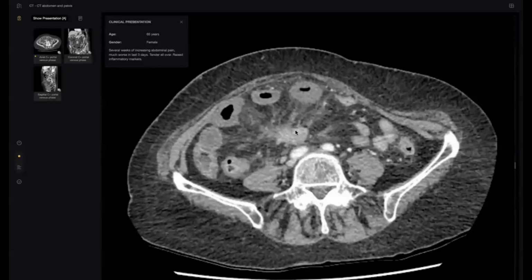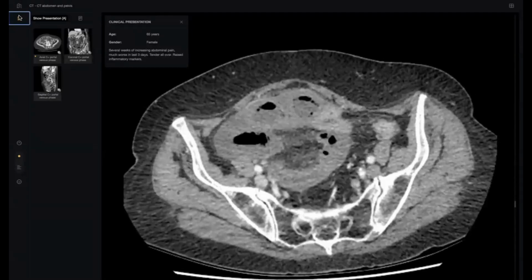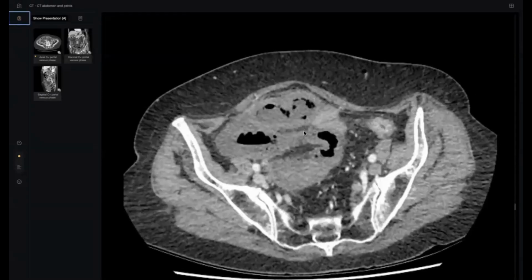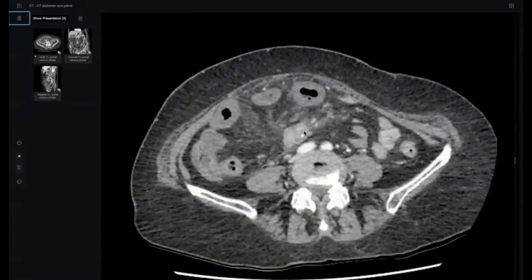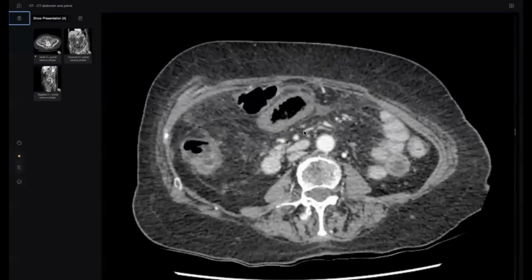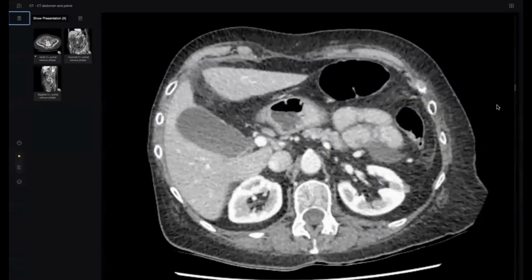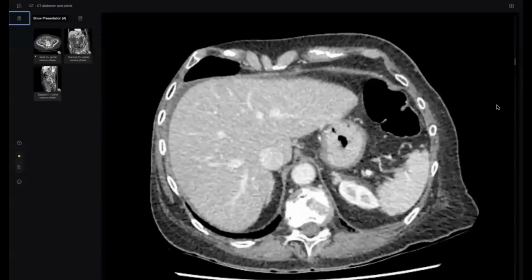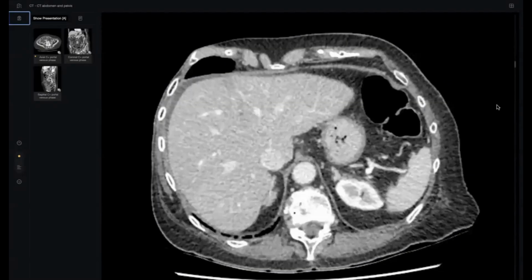Sir, I'm on the phone. Please, can you scroll for me? Yes. Hello? A 65-year-old female patient presented with abdominal pain. Okay, sir. I'm provided with CT scan abdominal images. I would like to have a look at the whole of the stack before commenting.